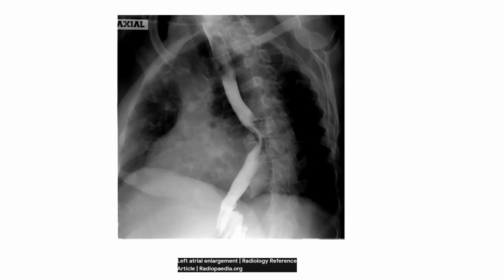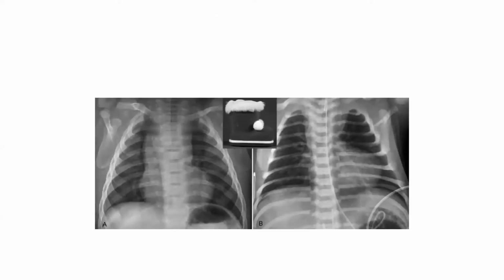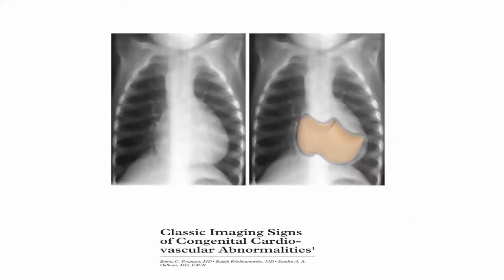Okay, good. Now what is this? A boot. I'm going to show you a better one. This one. What is this?